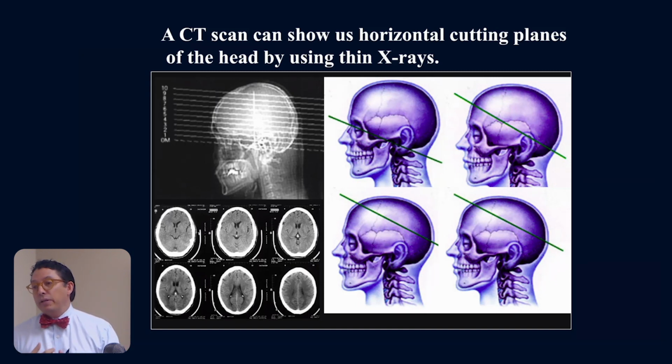And that only happened once we were able to do what we call isovolumetric voxels. What you're seeing displayed on the computer are our picture elements, or pixels. So these pixels belong to this data set of isovolumetric voxels. And pretty much all scanners have that type of technology.